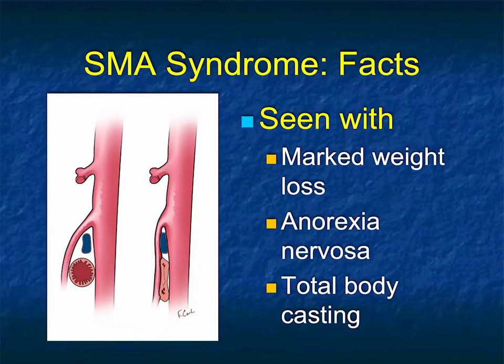Now, a few other things to mention. Anatomy could be one of the causes of small bowel obstruction, particularly when you have the stomach and proximal duodenum distended, and there's encasement, or the equivalent of encasement, where the SMA and the duodenum cross. You have that narrowed angle, and it's SMA syndrome.